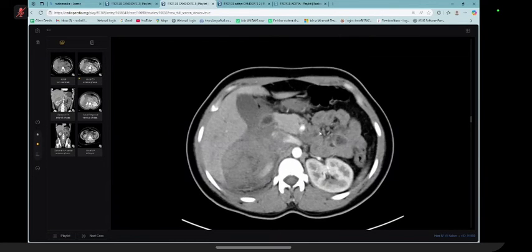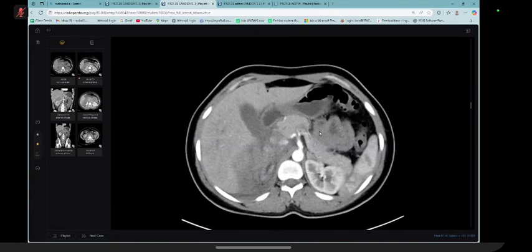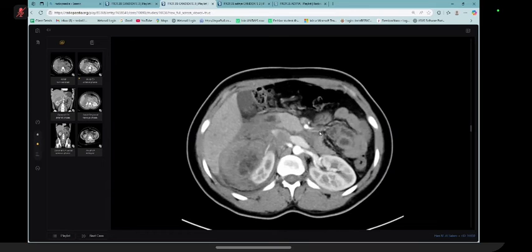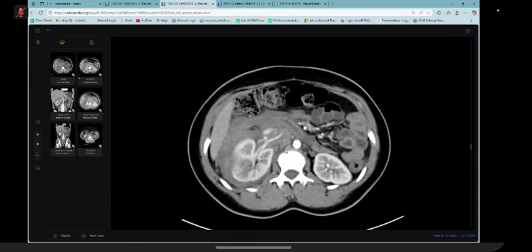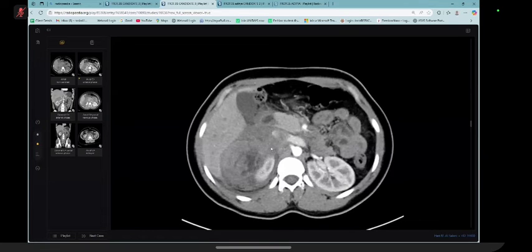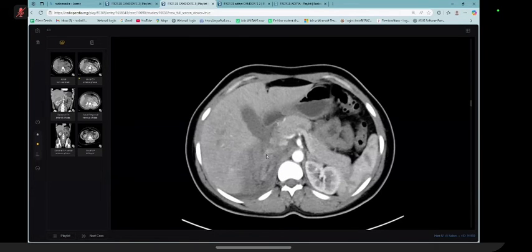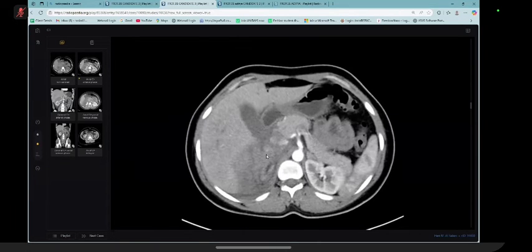Sir, I have been presented with the CT image of the same patient, post-contrast images, which reconfirms the finding of the hyperechoic lesion, which appears to be of mixed heterogeneous density involving the anterior cortex, and there is associated marked soft tissue fat stranding and a hyperdense fluid that is seen in the pararenal region. And it is extending to the suprarenal region as well.